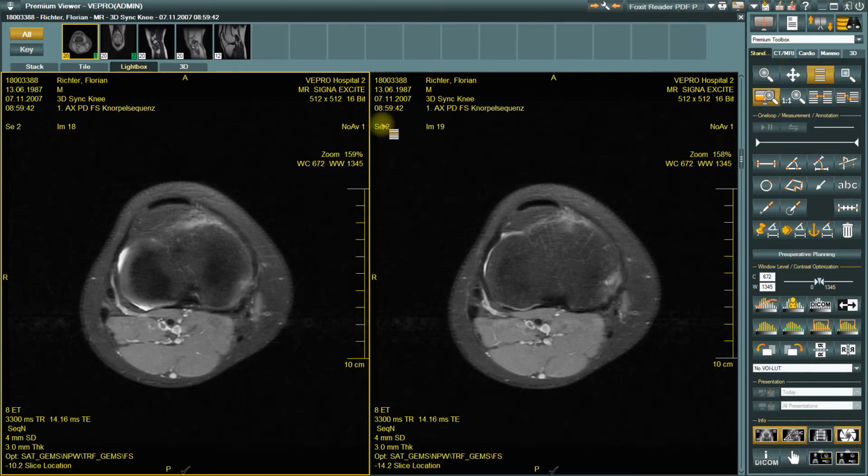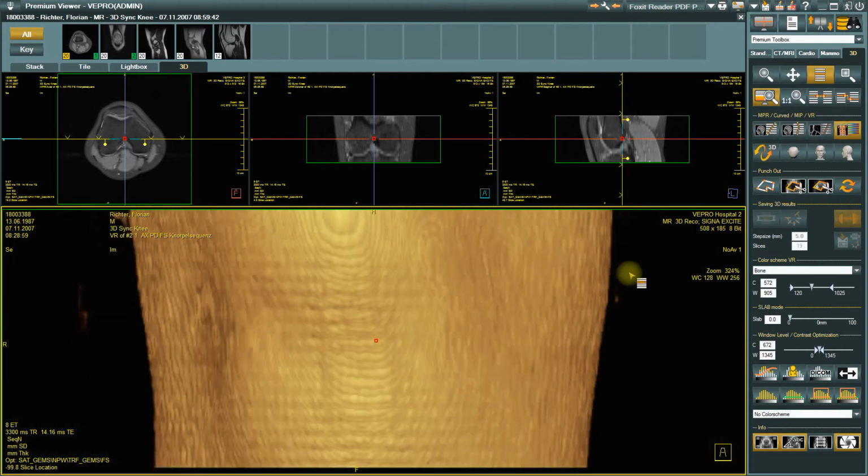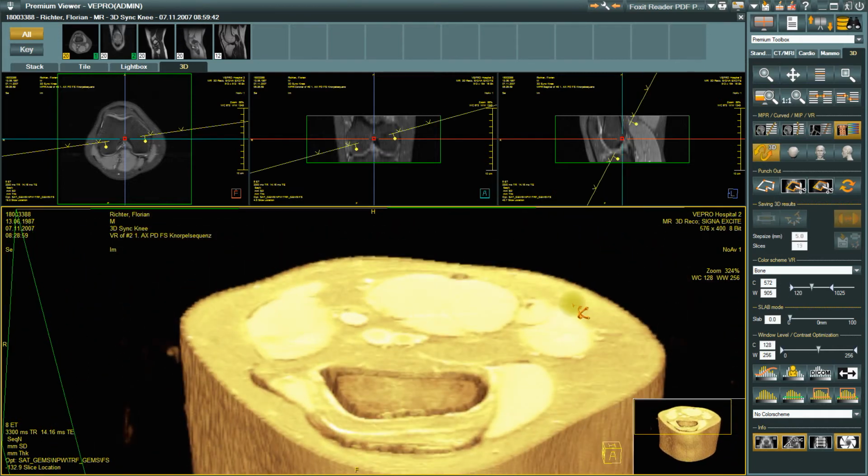If the 3D module of the EMR Manager is activated, this view can be used to display and further edit slice data from tomographic images in 3 dimensions. The data for all images displayed in the 3D view will be synthetic and interpolated image data. Therefore, for diagnostic purposes, the original data must also be used. Use of the 3D features is explained in detail in another video.